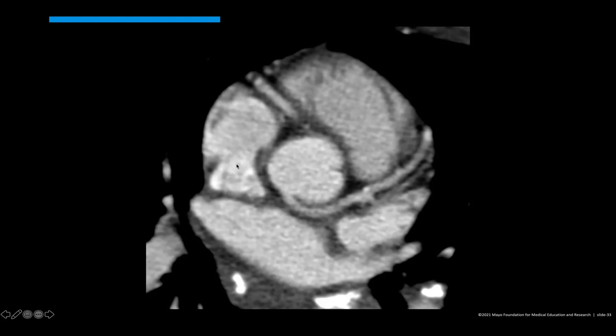This is the superior sinus venosus, or the superior cavoatrial junction near that area. So hopefully that gives you a good explanation of how to orient yourself, what structures to look at and identify to help you figure out which sinus you're looking at. Yeah, that was great. Thank you.